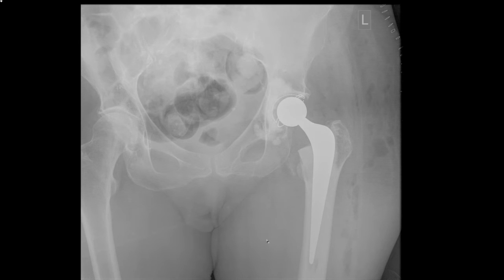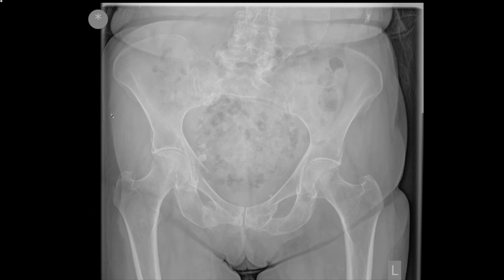So this is the same patient who's had her femoral neck and head removed and replaced by a prosthesis as here. This has to be performed when the head is ischemic, but is often a common way of treating femoral neck fractures. Here is another lady who has fallen, and the clinical history is query fractured neck of femur.